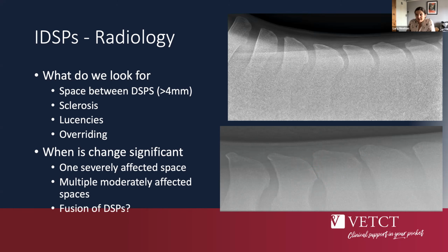So the discussion is, is that a significant change or not? And when we're presented with these in the context of a pre-purchase examination, I think that makes this even more contentious, really. I will say that I think that this is possibly an incidental finding in the absence of any other evidence of back pain. However, I would say that this may progress with time to being a clinically significant lesion.